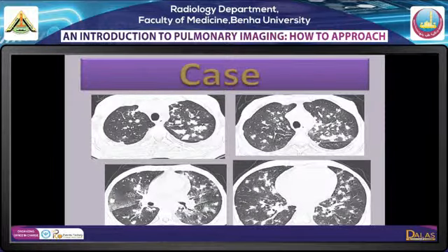Flame shaped, relatively large nodules. Some of the nodules are pleural based that are related to the fissure and the pleural periphery. اخر حاجه ان في prominent bronchocentric interstitial. فين افكر في ده؟ يعني لو شفت ده في حد مش في دماغي فيه كابوزي، تمام، ده شكلها حاجه انفلاماتري بس هقلق.